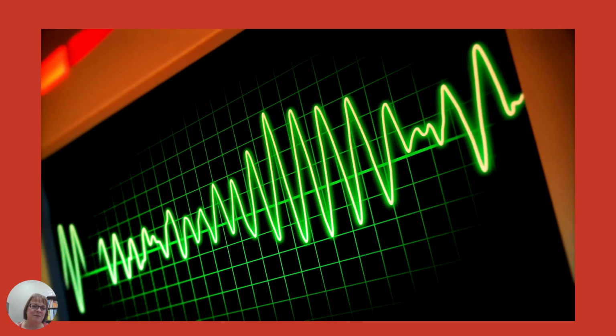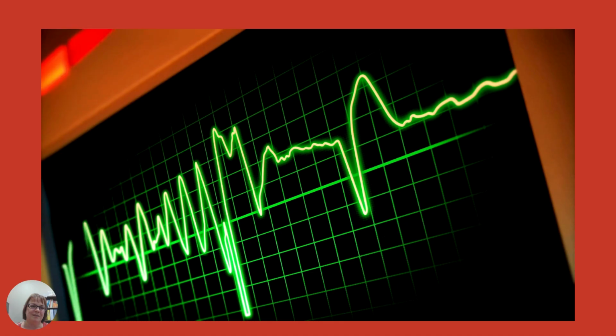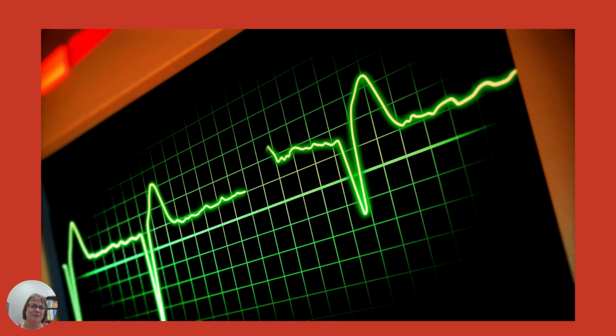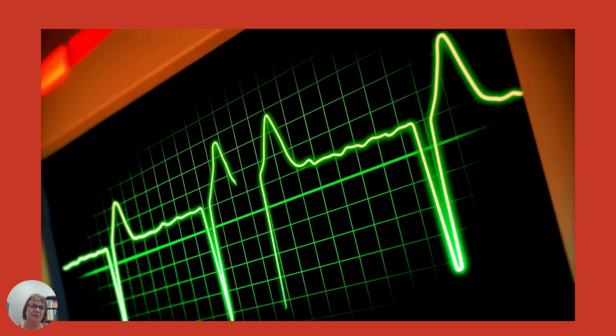Okay, so here's some VTAC. We got some big ones, little ones. Not good. And now we've got them back in a rhythm. They must have shocked them.